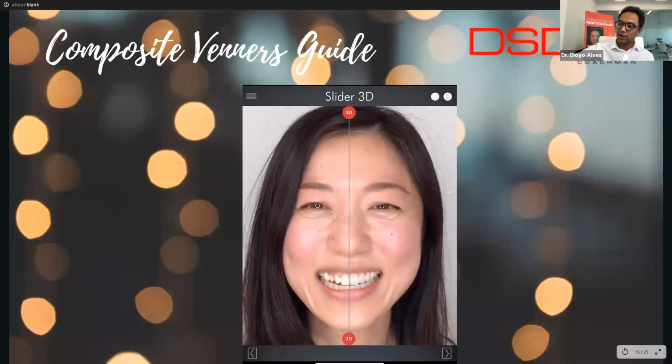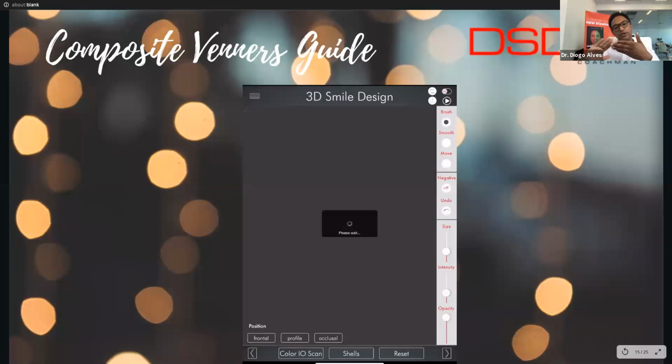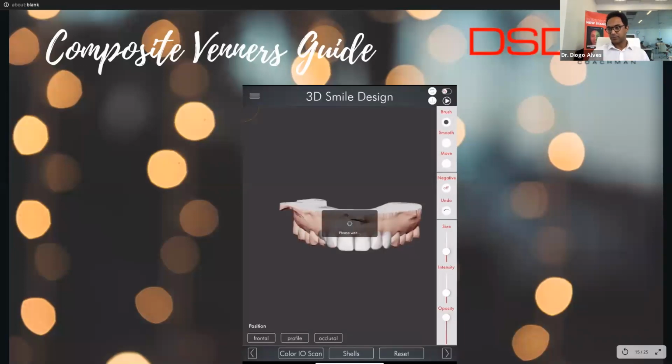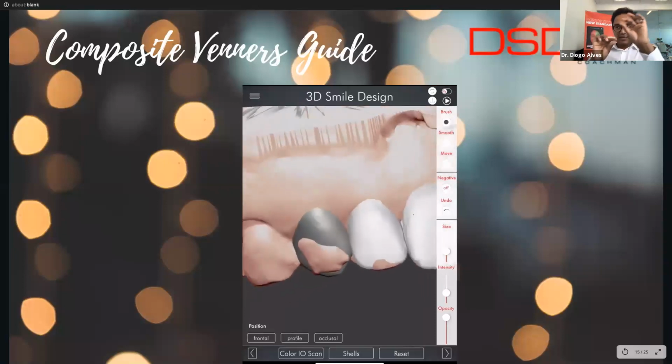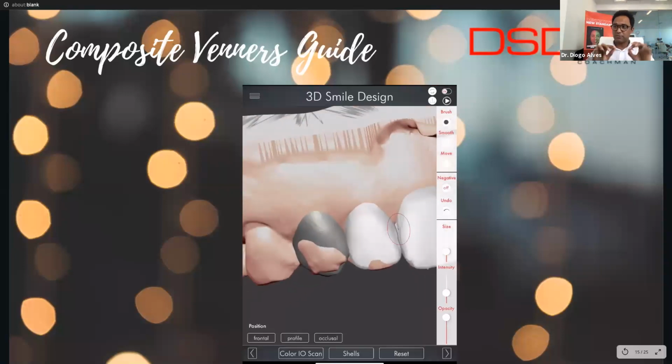And look at over there. You'll be able to copy exactly the same from 2D to 3D. Then of course, if you need to make some final adjustments, we have this sculpt tool, and you'll be able to just make small adjustments in it.